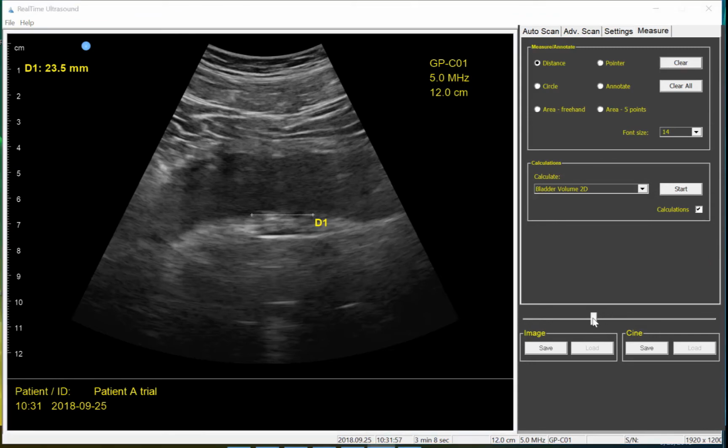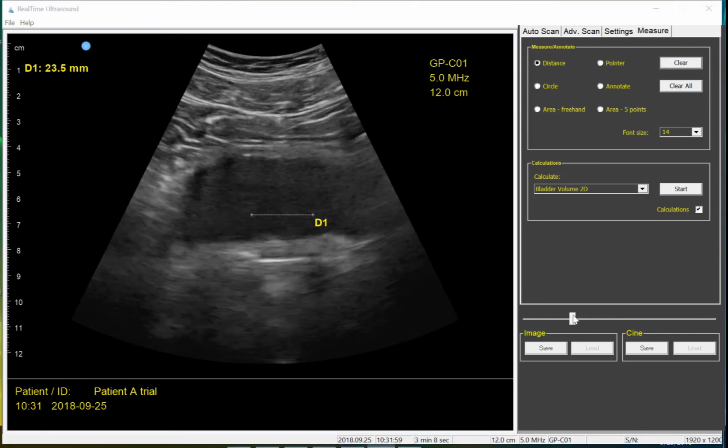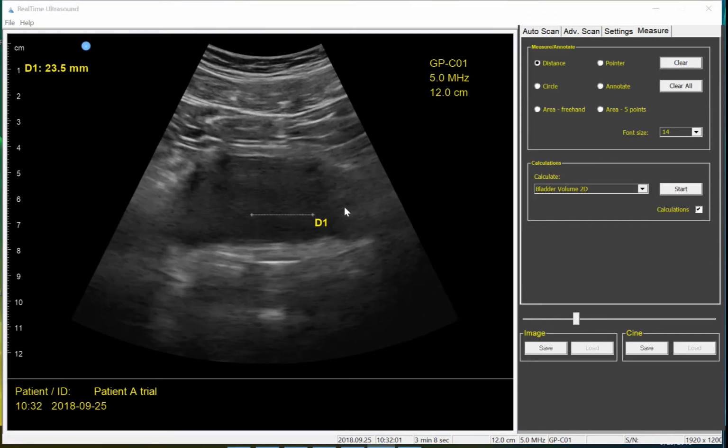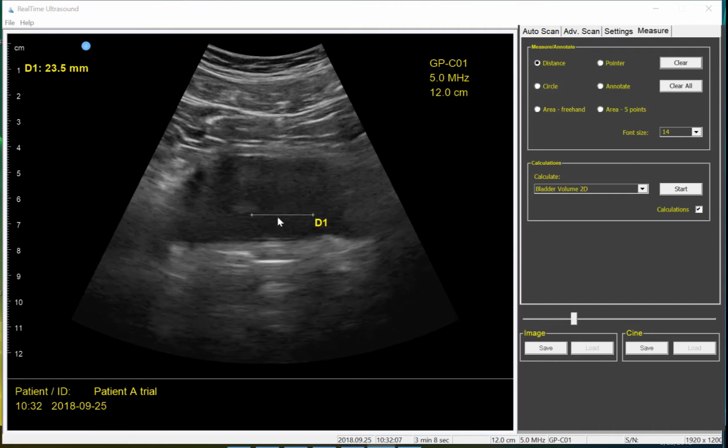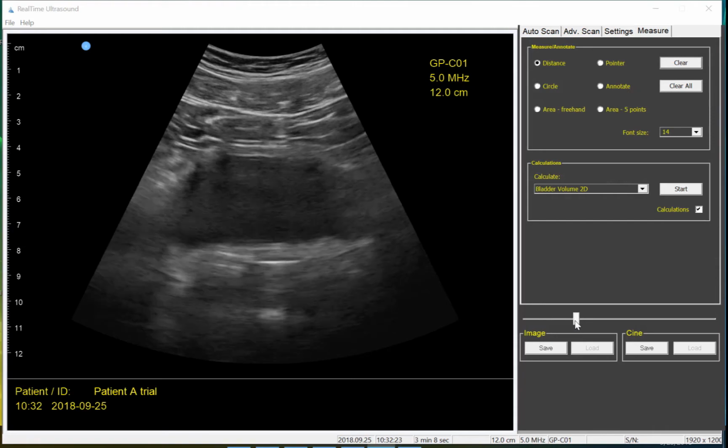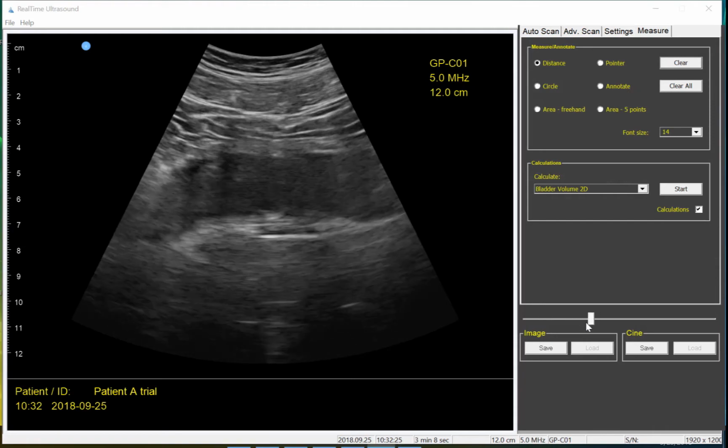I didn't like my first position. Now I go back and use the scroll bar again to mark the valley. I decided I didn't like that, so I'll just try again. I'm going to then use the distance measurement. I could have made another horizontal mark there, but I didn't. Didn't like it, but that's really great, you can just clear it out. Now I'm pretty happy. That ends up being 10.4 millimeters, in the left-hand upper corner. You can see that. So I'm going to make a couple of measurements.